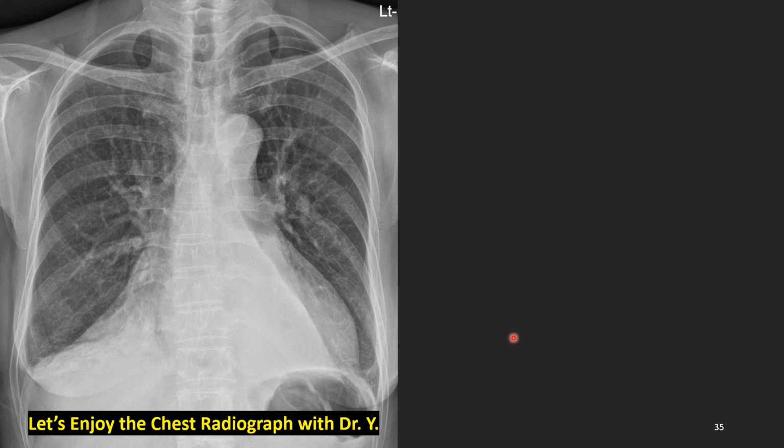This is the last slide of collapse atelectasis. Does this look very interesting? Very attractive? What's wrong with this one? Okay, first we know this. Yes, left lower collapse. What do we see here? Before going to right side, we have to admit that left hilum is inferiorly more displaced because left lower collapse is here. So this hilar level cannot be the standard over lower left hilar level.